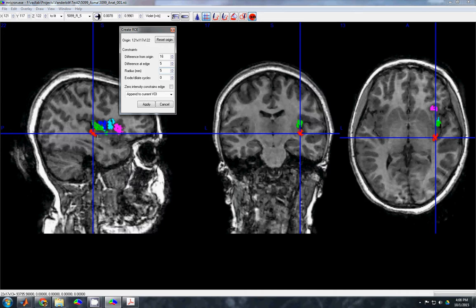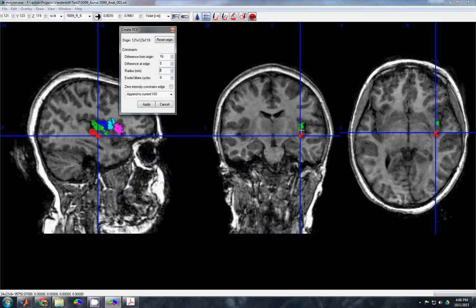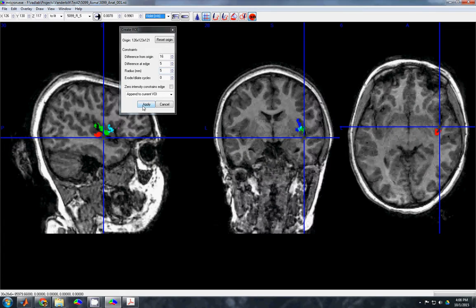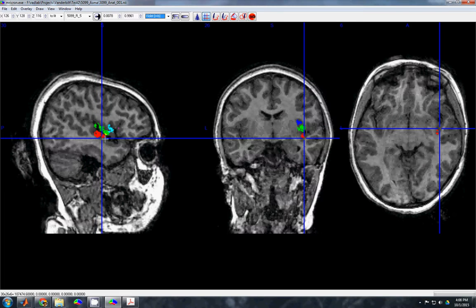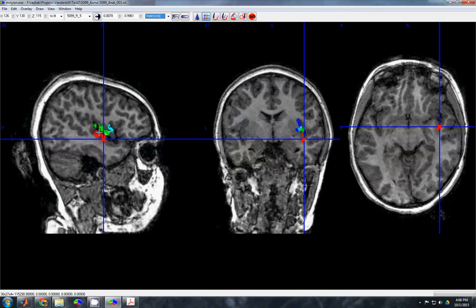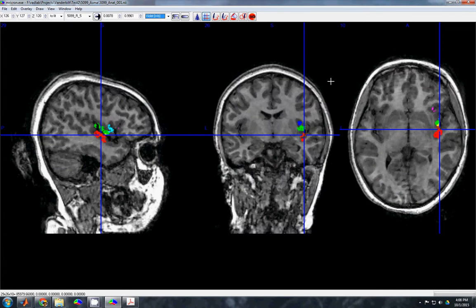So bam, move a little further down. And I want to really make sure that I go all the way out to the surface, so a bit more laterally, away from the midline of the brain. And color all this in too, because this is all part of it. This is where we're really going to get a lot of volume, the surface of the insula, because it's away from the white matter, it's where we're going to get a lot of the actual neuronal bodies that make up the gray matter, and not all the long connection tubes that make up the white matter.